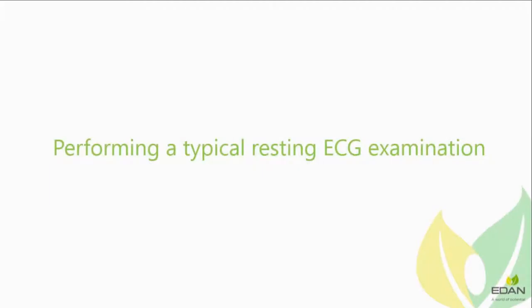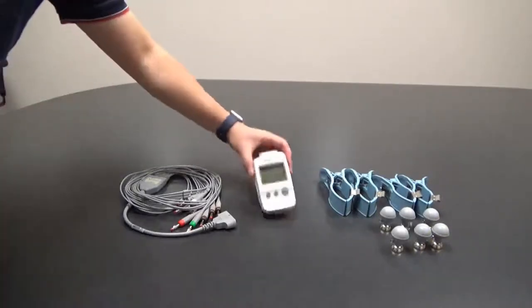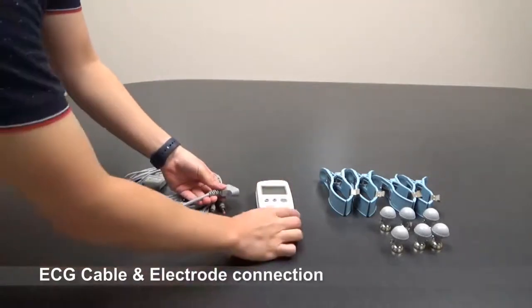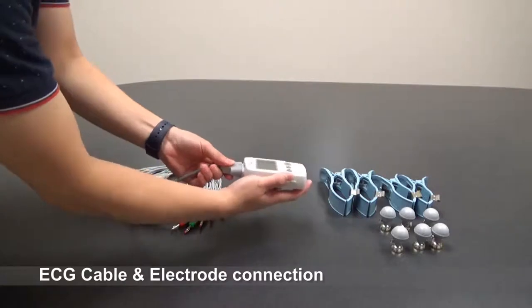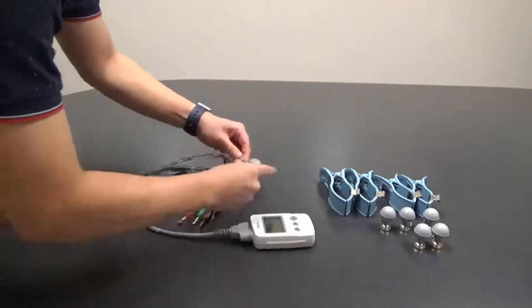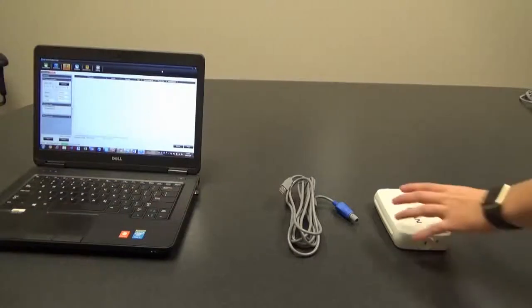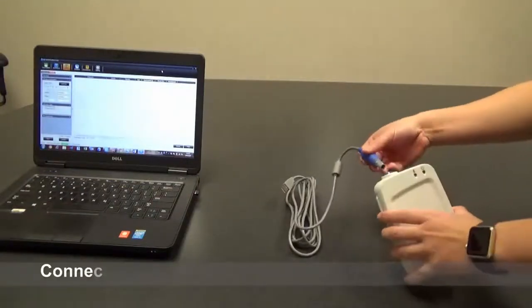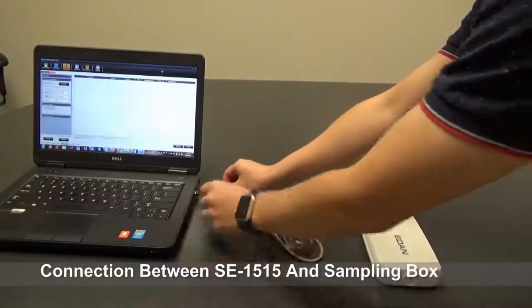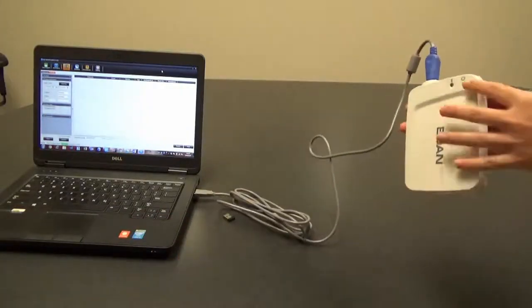Performing a typical resting ECG examination. Power on the sampling box. Connect the ECG electrodes to the ECG cable, and then connect the cable to the sampling box's corresponding port. Carefully connect the ECG sampling box to the computer via USB cable. Make sure the power indicator illuminates.